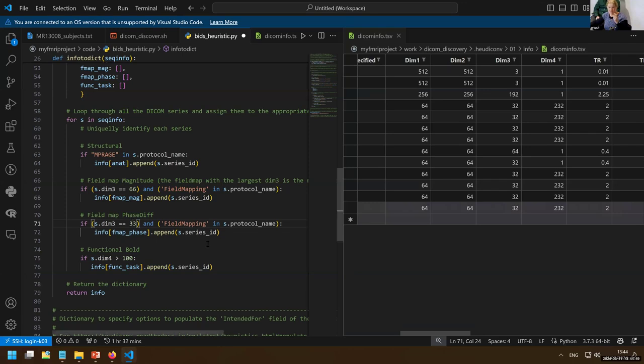Yeah, but in this case, in the tutorial I was using one of the CBU datasets, and this example is also a CBU dataset, so there are some changes. Here I actually need to change this dimension to 64 and this one to 32. If I don't change it, it will not convert, because it will not find this.